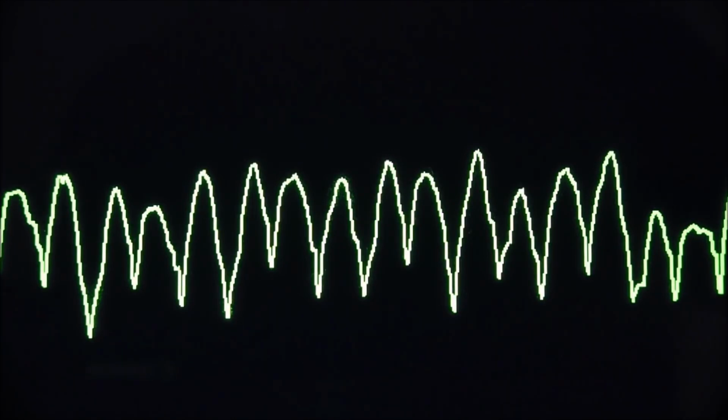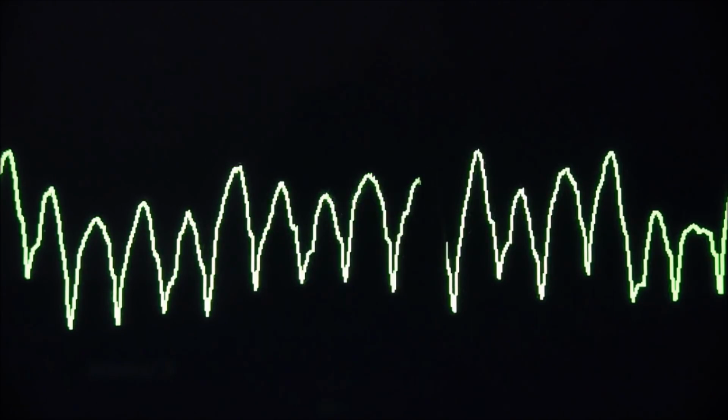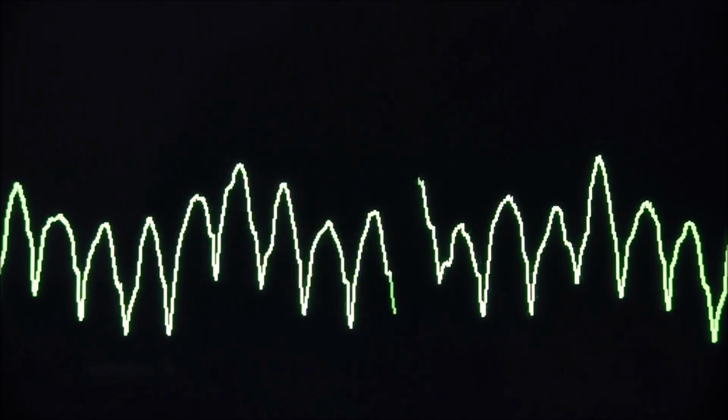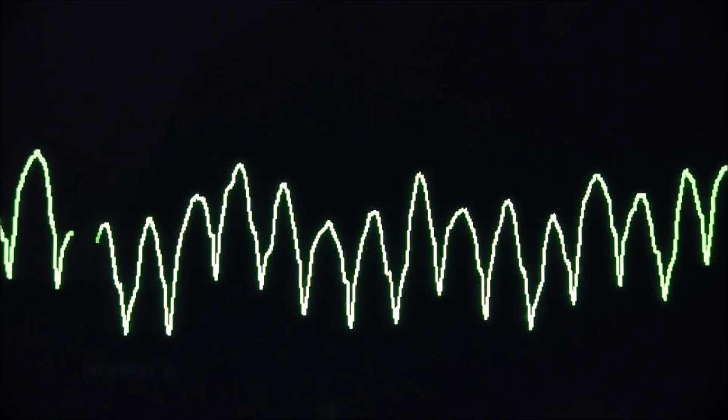And if we don't treat this condition, this ventricular tachycardia, it will become a ventricular fibrillation as the rhythm gets finer. And we have to treat this with defibrillation. It's one of the shockable rhythms. So there's only two shockable rhythms. There's ventricular fibrillation and this one, which is ventricular tachycardia. If the patient's not unconscious, we have to, of course, anaesthetise them prior to administering the shock.